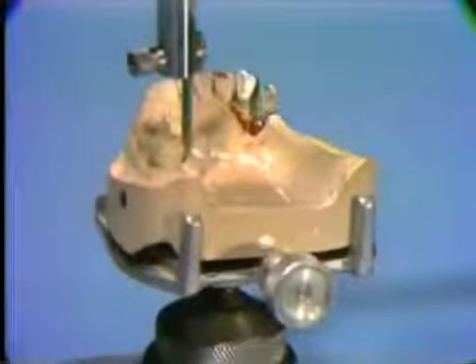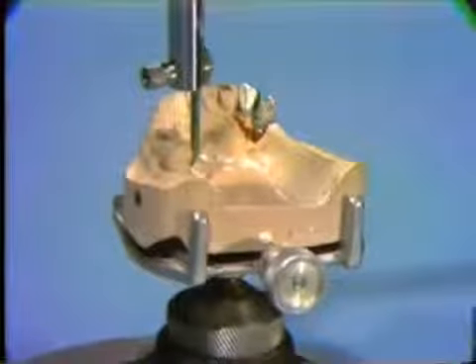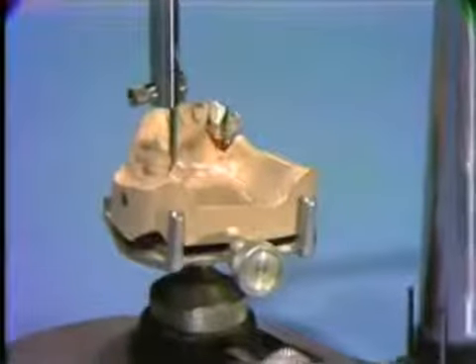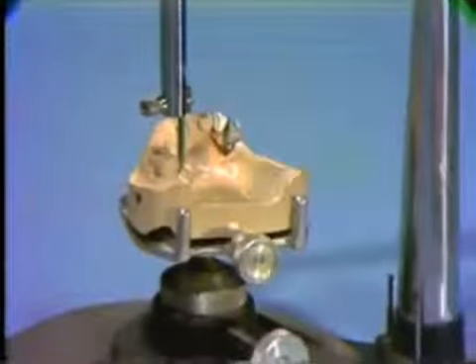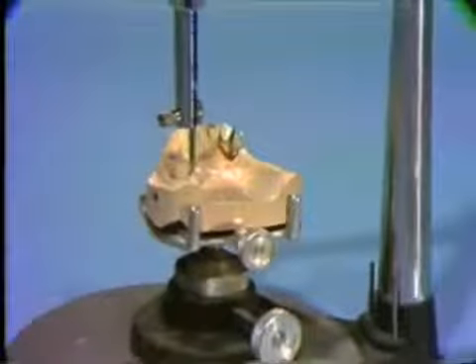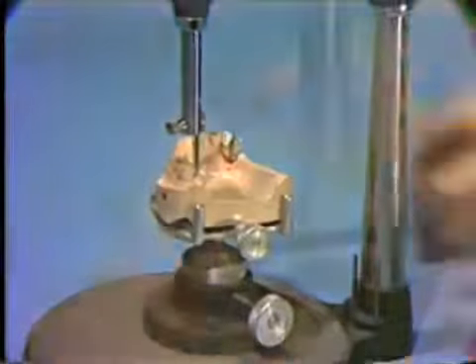After the working cast has been mounted on an articulator, and before the abutment crown can be waxed up and surveyed, the final path of insertion and removal of the proposed partial denture must be not only determined but preserved. The proposed path of insertion and removal was established during the preliminary survey and design of the diagnostic cast. Any tooth reduction or modification may necessitate a change of that path. The final path is determined by many factors.